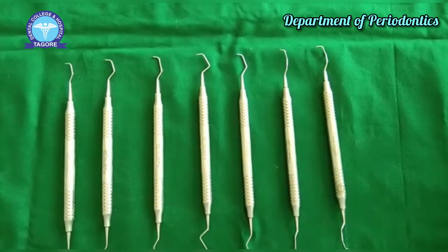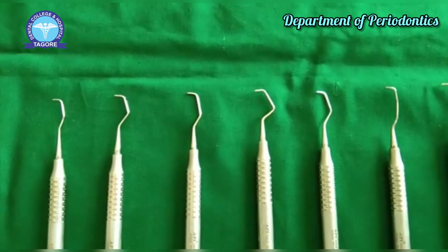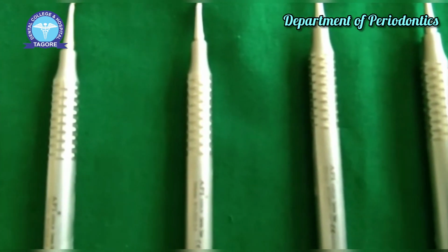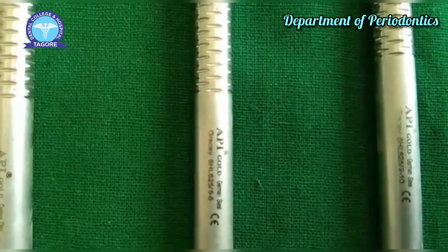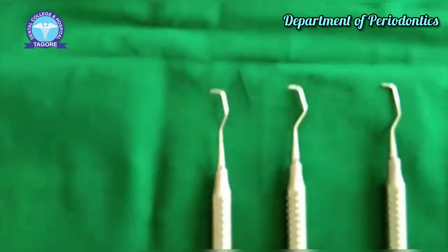These are area-specific curettes, which means each curette is used in specific areas of the teeth. Area-specific curettes are called Gracey curettes. Each Gracey curette has a designated number. 1, 2, 3, 4 are used in the anteriors.